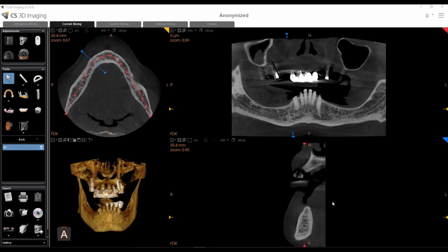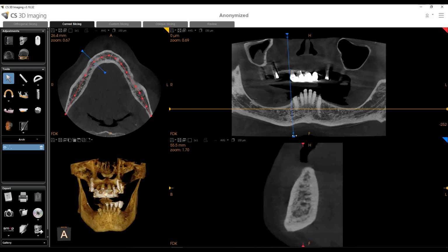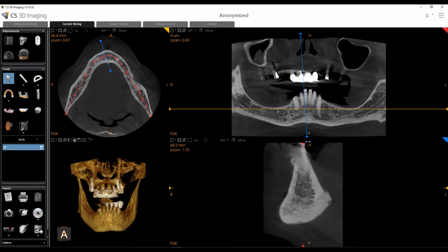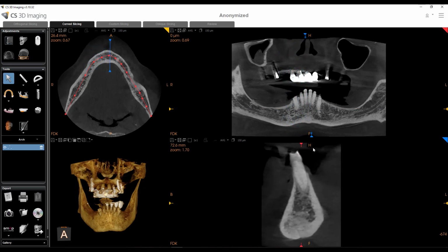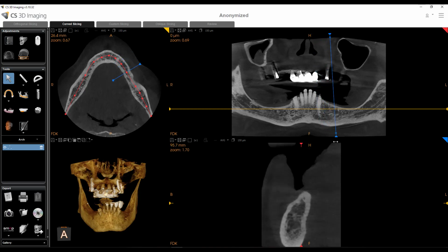Okay, so here's one case example, and this patient was scanned for implant planning in the mandible. And there's a couple things that I see some users will do. They're going to simply focus in on the mandible. So you could zoom in and then take my cross-sectionals and then treatment plan everything in just the mandible. By doing that, of course, we're neglecting evaluating the entire scan.